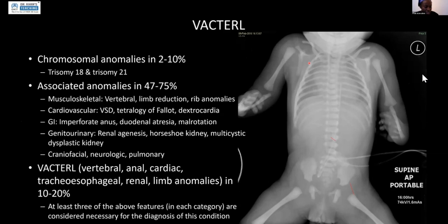If they show you this case in an exam, you need to make sure that you're looking for all these other signs. I just wanted to mention the UVC and the UAC. Neonatal chest radiographs tend to have multiple lines in situ. So as candidate 3 did there, you need to assess the lines and check the positions first before you then go on to present the pertinent findings in the chest or abdomen.